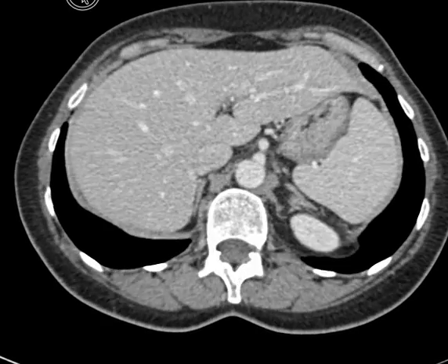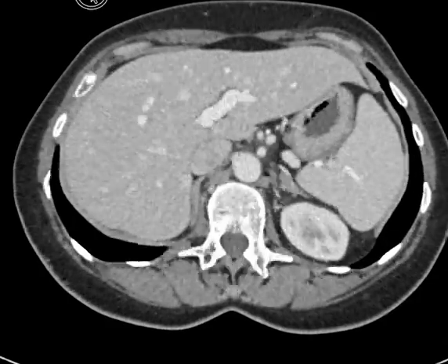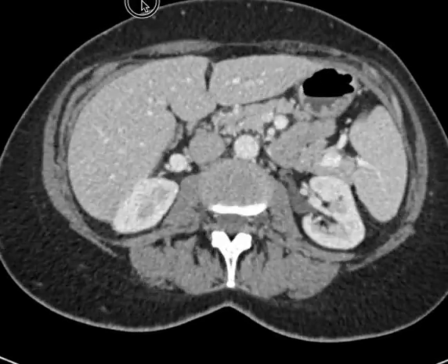Okay, so that's a look at the gastrointestinal system. One part that doesn't really neatly fit in is the spleen. So again, here's the spleen. We'll do another look that goes at the genitourinary system separately.